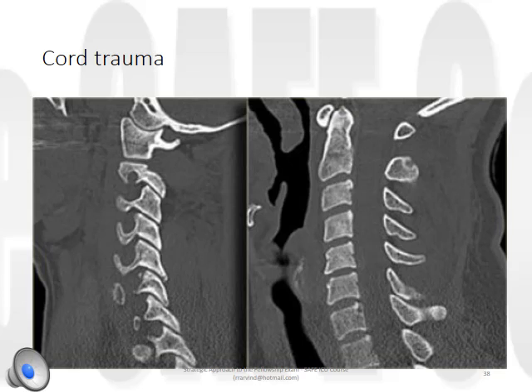After the second fall, she had complete loss of motor function and sensation, and her physical examination showed a lower extremity paraparesis with some upper extremity weakness on the right. So initially they were thinking a central cord injury. Now, if you have a look at the sagittal CT scan that's here, it's not all that remarkable.